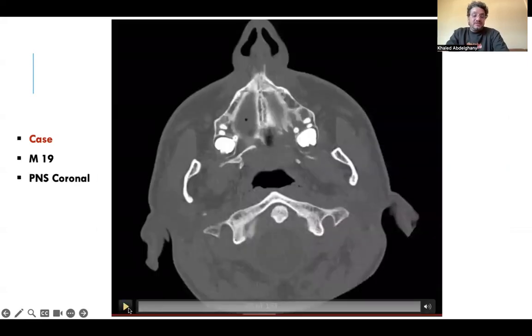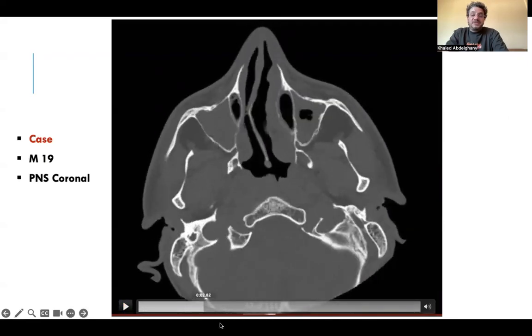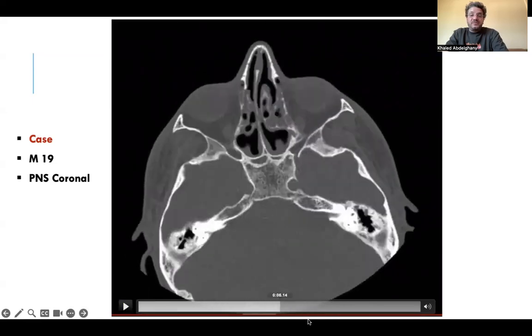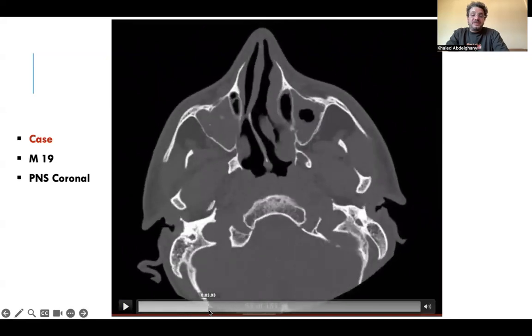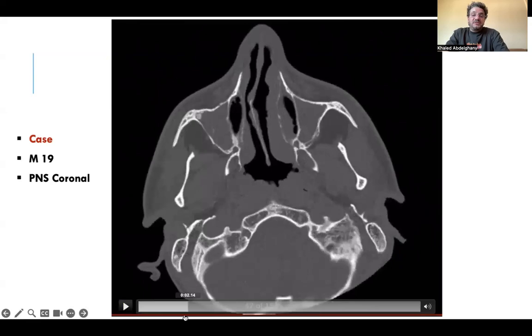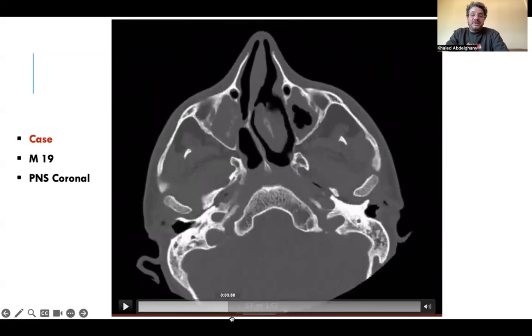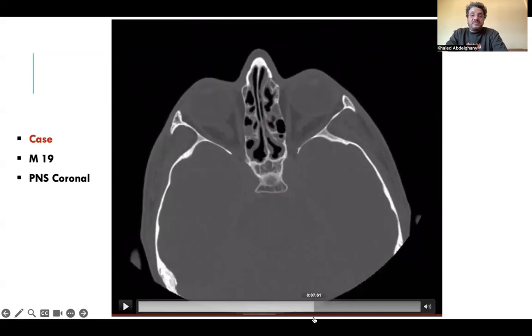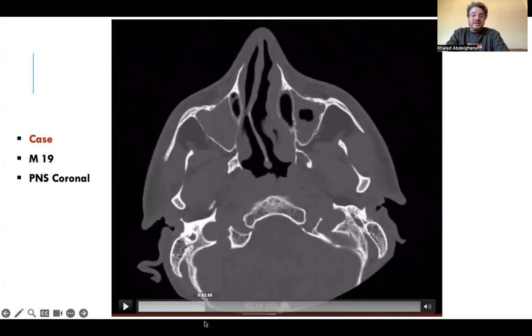This is the paranasal sinusitis, the other part of the sinopulmonary infection. We have chronic sinusitis with mucoperiosteal reaction, with new bone formation in the right maxillary base. We have frontal sinusitis, ethmoiditis, and both maxillary sinusitis.